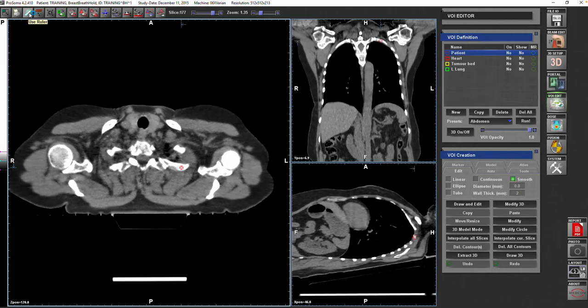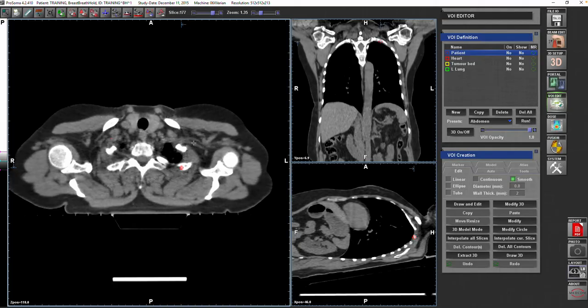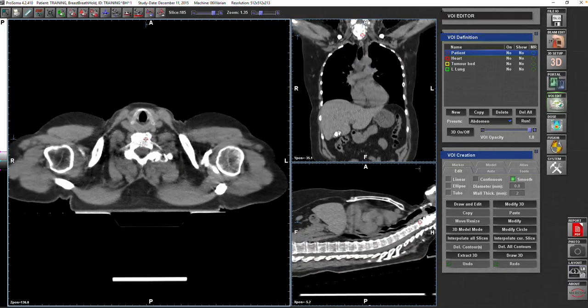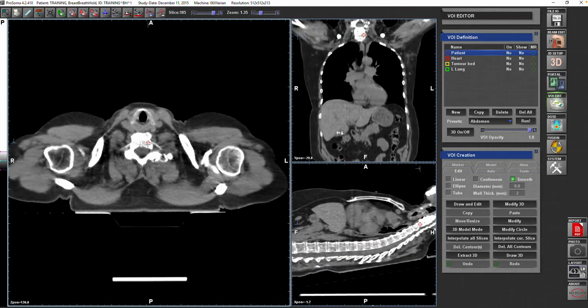We have also the RTOG guidelines, but this time the RTOG is not following the vessels. It follows the anatomical landmarks, and we can talk about it later on. So you need to familiarize yourself with the subclavian artery arch and where it crosses the first rib and the clavicle. This is a very important landmark.